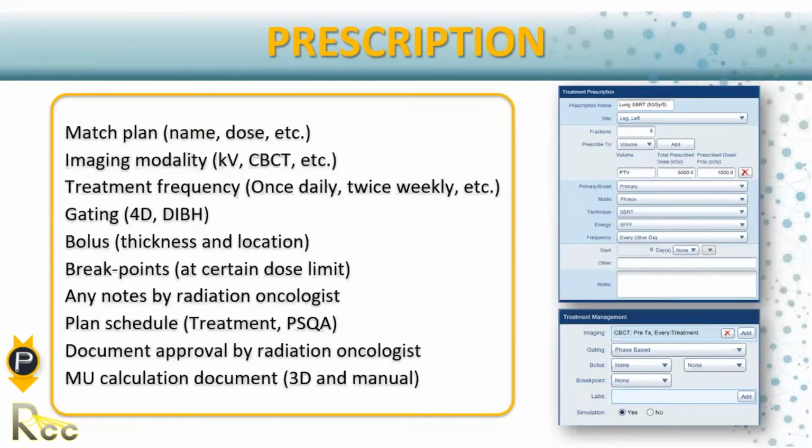By this, I finish the first part, and I will go to the next part, which is the high quality plan and tricks in optimization.